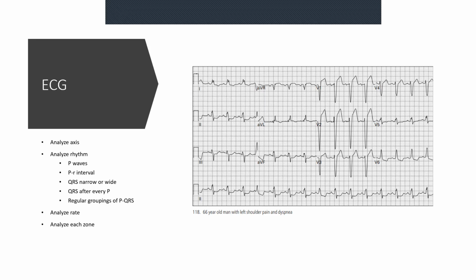Now, just jumping a little bit ahead, we're going to talk about left bundle branch blocks. And left bundle branch blocks, for some reason, trip people up. So what we're going to do is use our system that we've been using now for, what's it going on, 2.5 years? 3, I think. And we're going to analyze this ECG, and we're going to go through it step by step by step, and try and figure out what's going on, because it's one of the easiest things once you get the hang of it, but it's one of the scariest things to see coming out of an ECG machine.